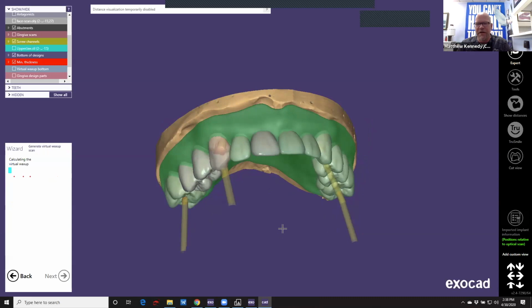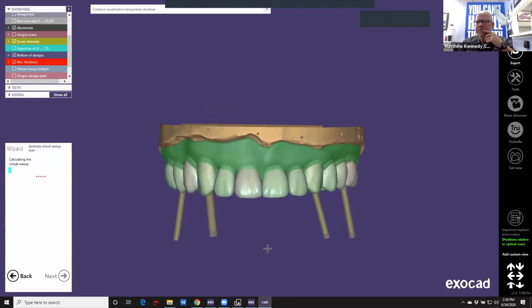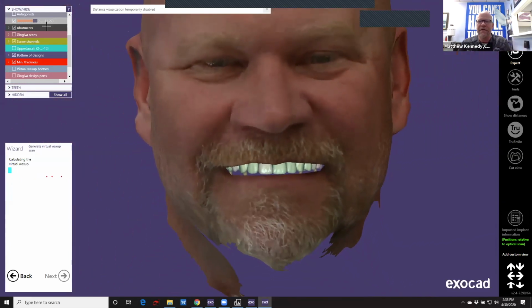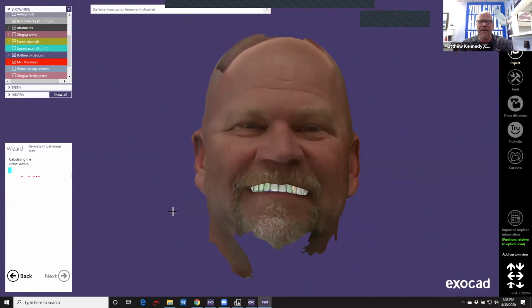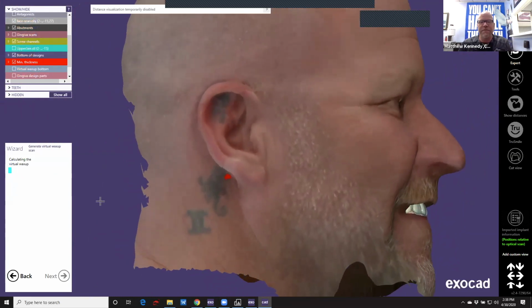This just takes a couple minutes. It's doing a lot of jobs right now, and it's having to think about it. Again, the big old noggin. You know, that's a great feature to have. And yes, I've always had a hole in my head. Even the tattoos show up.